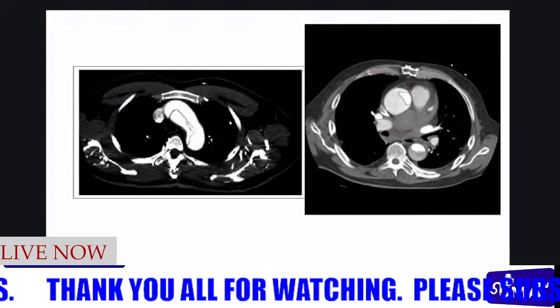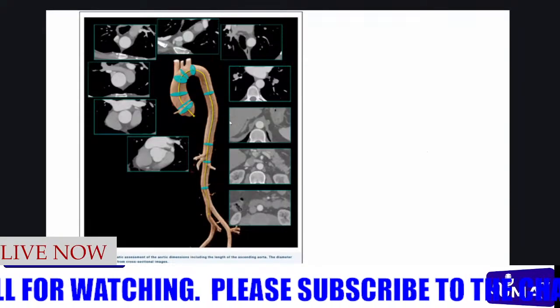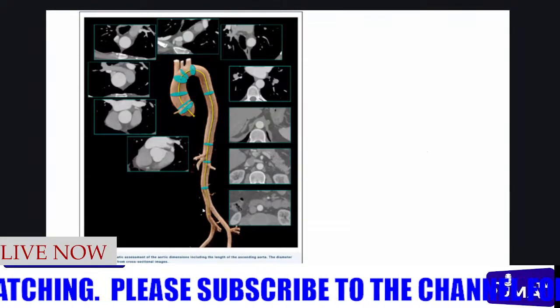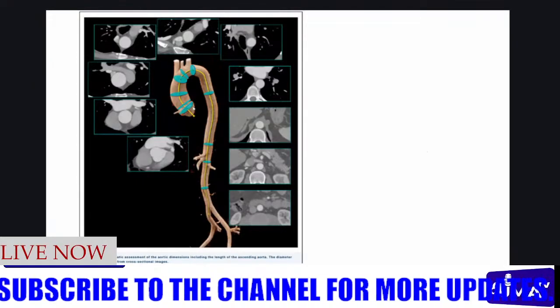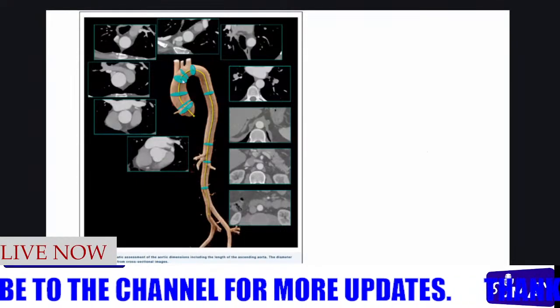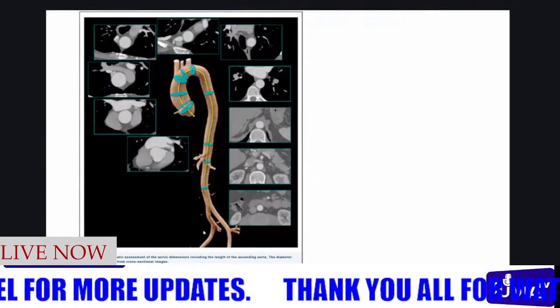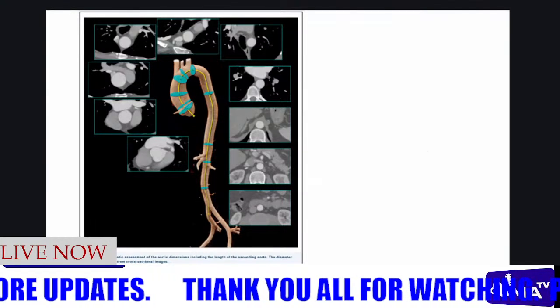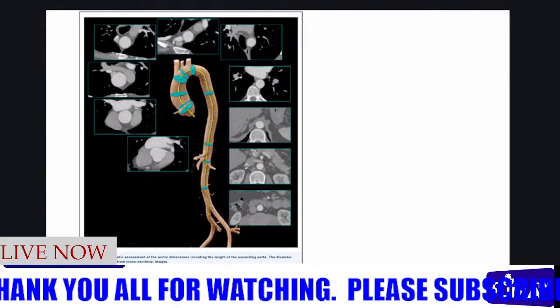This we've gone through already. This, for the radiologist, is important. When we are getting measurements, we want measurements at all these points in blue. Because if, for example, we want to put a stent, we size the stent according to the measurements given here.